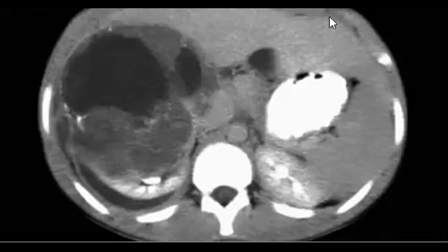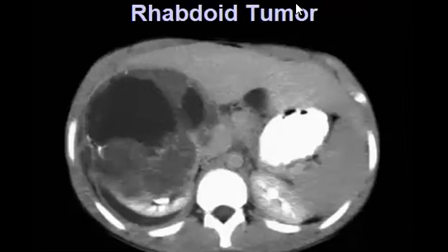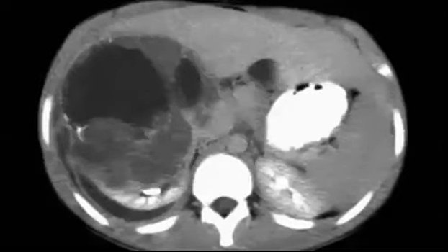So what will this be? It will be something called rhabdoid tumor. It's not common, it's rare, but they like it in the MCQ because you will find a synchronous intracranial neoplasm. So when you find something like this, you are talking about rhabdoid tumor. Is it clear?